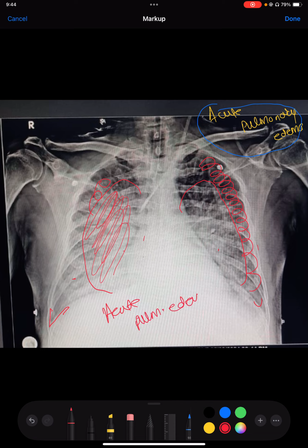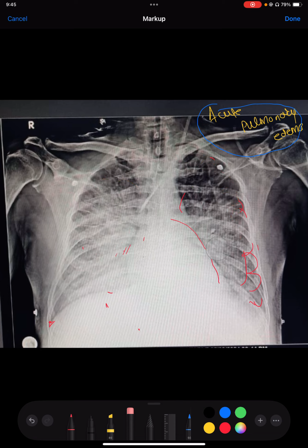If it is chronic pulmonary edema, usually the patients have bilateral pleural effusion, and very commonly we can see a dilated heart, which is missing here. One more thing we can see is a central line or dialysis cannula put through the left IJV, and this is an endotracheal tube which we can very clearly see. And that's all for now, and thank you.